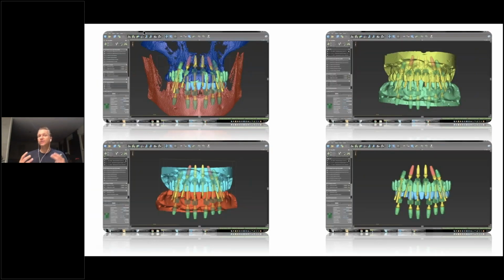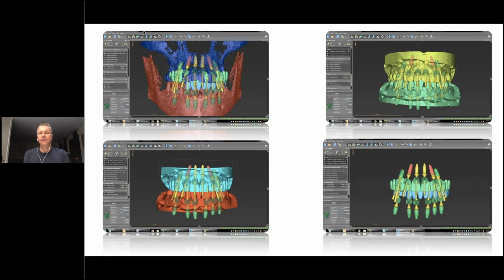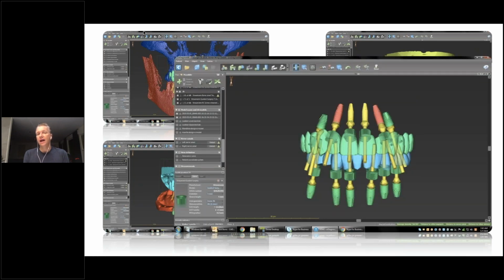I can utilize that specific information in my implant planning software. So that's where I also love the M-Smile to design the diagnostics and export it to my implant planning software. Here I'm utilizing co-diagnostics. On exocad I can use exoplan. Same thing, I can utilize this information in planning my implants. And now we're going into the implant treatment as a first step. So we're planning the position of the implants, finishing up the design of the temporary in relation to the implants, or actually the implants in relation to the temporary.